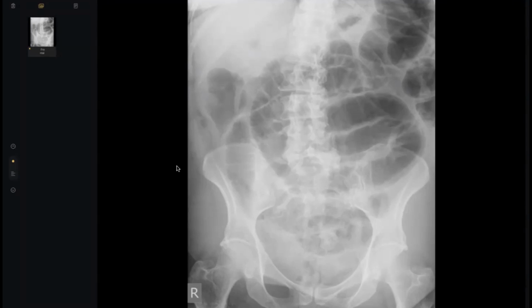Okay, sir. So this area, the right margin of the right hepatic margin. No, this is the paracolic fat. Okay, paracolic fat. Then I will see the air at the falciform ligament. Sometimes air also accumulates at the falciform ligament, but in this case, I don't find much air. And apart from this, an important sign, small bowel. The epigastric region air is also there.